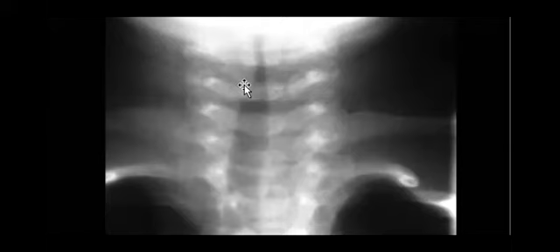A steeple sign, you mean croup, right? Croup. Yes, if it is symmetrical and more sharp, maybe yes. I agree with you. But let's talk about if this is one side or unilateral tracheal narrowing. So you are talking about maybe foreign body as well, maybe mass, maybe infection.